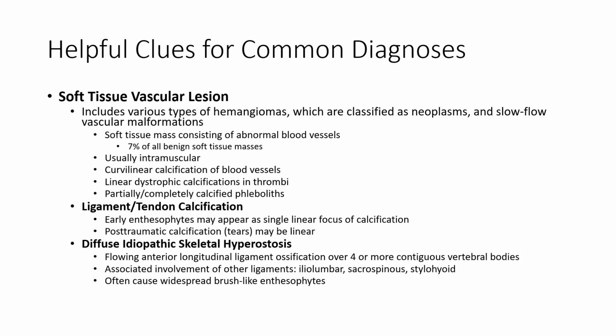Ligament and tendon calcification: an early enthesophyte may appear as a single linear focus of calcification. Post-traumatic calcification may be linear.